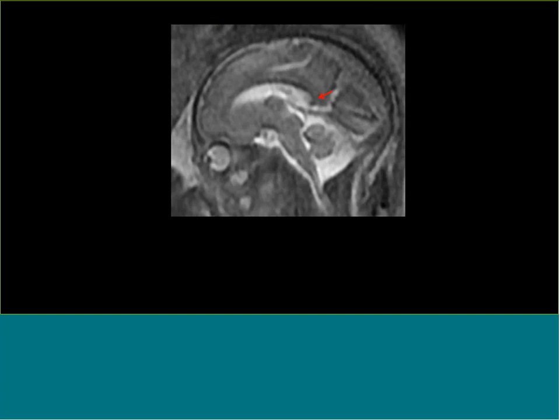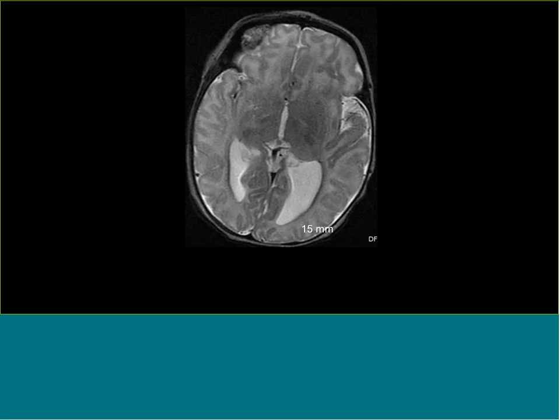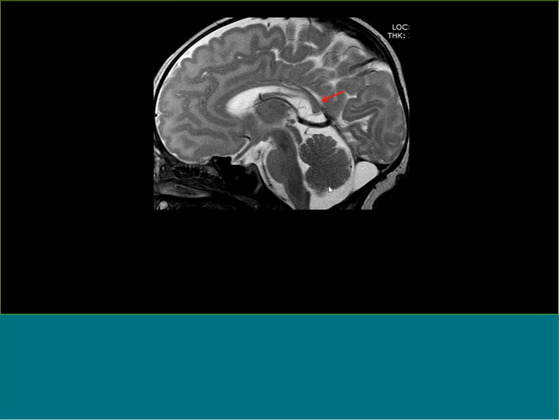This is the corpus callosum of that child, so you can see those they identified. This is this child after birth, and this child actually did pretty well in the sense that the ventricles got progressively smaller as the cerebrum grew, and it seemed to be a pretty normal cerebrum. So this was a somewhat happy ending, I suppose.